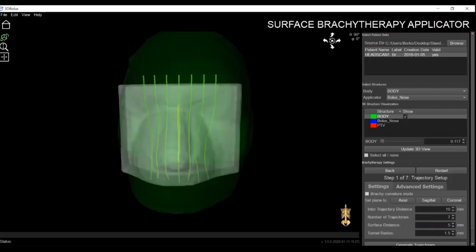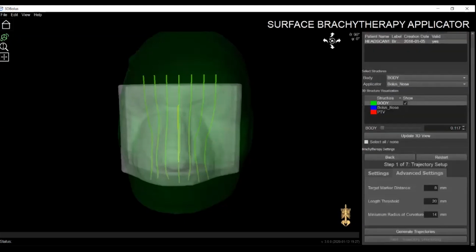Again, all these settings and advanced settings I talked about in our last webinar, and this webinar you can also find on our YouTube channel, Adaptive's YouTube channel. And as I said, today I will mostly focus on the new features that can be found in version 3.0 of our software. So let's go to the next step.